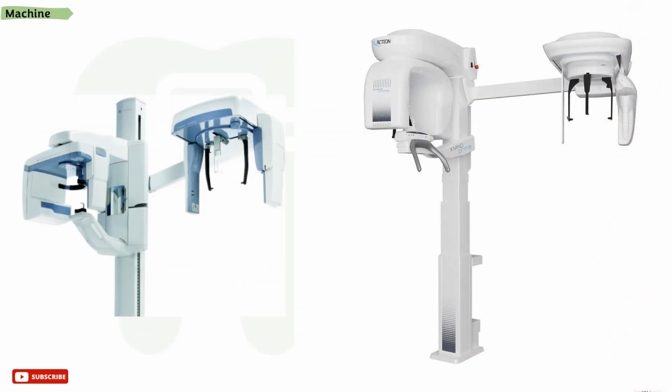Here is a close-up of the cephalostate, which is the head positioner. It includes the 2 ear rods. These are inserted in the external auditory meatus of the patient and the forehead clamp that stabilizes the head in the correct position.